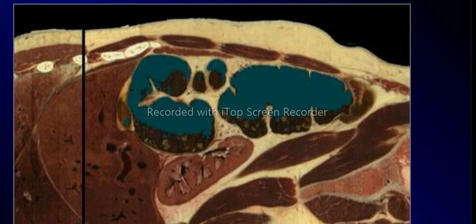If we go to the second section, this is the kidney now appearing a bit more. On the previous image, we were looking at the lateral edge. Now we can see the kidney beginning to appear. And then we have the psoas muscle here that gives the kidney this orientation. You have the lower pole and upper pole of the kidney. The lower pole is pushed away from the posterior aspect by the psoas, so it lies more anterior than the upper pole, and the upper pole appears deeper, just like you see.